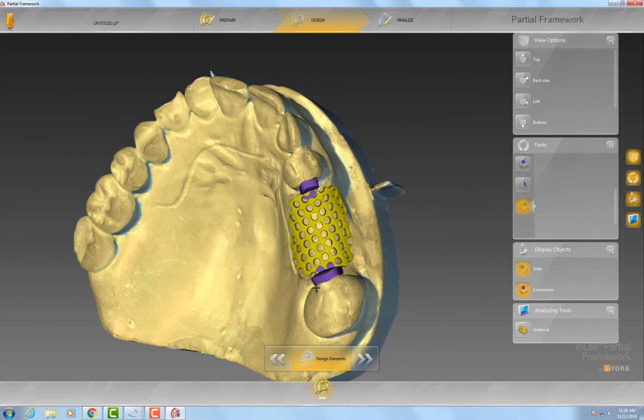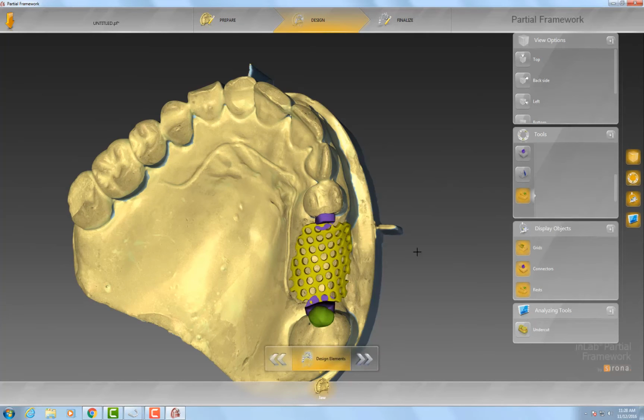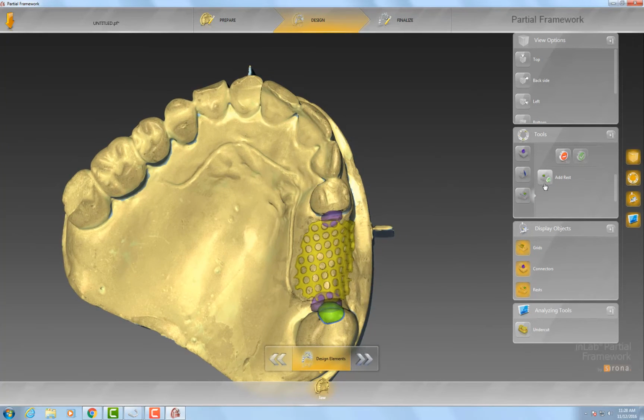Now I know some people like to do their base plates first, things along those lines. I don't know, I just like to get all my little accessories out. Oh, wrong area. Accessories out for a little bit of the reasons. I don't know why, I just do.